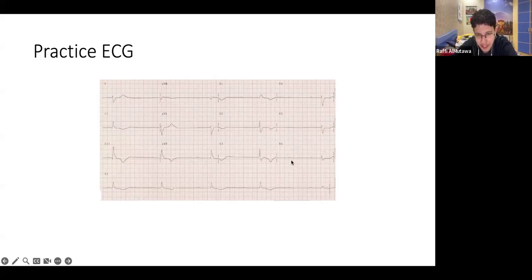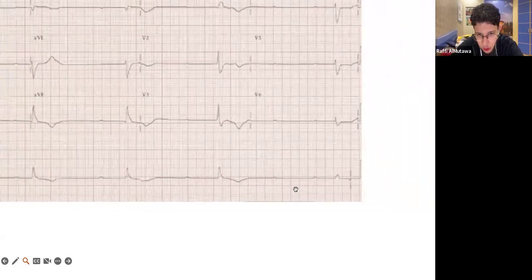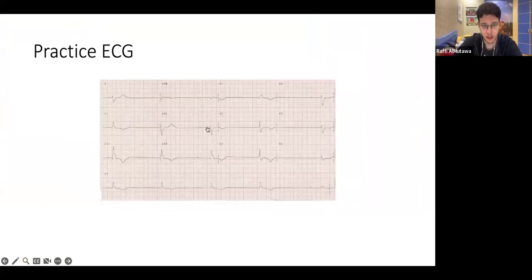If you see these P waves right here, there aren't QRSs associated with them. So this is third degree heart block. Whoever said third degree heart block first was correct. You have random P waves and random QRSs, but it can be so obscure. The reason I'm bringing really obscure images is in case they decide to make your exam pretty tough. But look, if you zoom in, there's a P, QRS, they're not really related, if you guys see. And it shows even more here, P, QRS, inverted P, they're not related to each other whatsoever. So whoever said third degree heart block, good job.